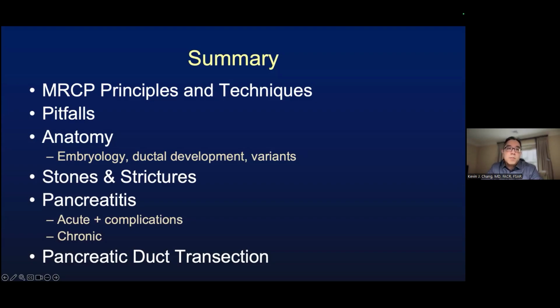So in chronic pancreatitis, you've got inflammation, recurrent inflammation throughout the pancreas or fibrosis or whatever the etiology of that chronic pancreatitis is, and it affects the duct in multiple locations. So you get that beaded appearance rather than the smooth upstream ductal dilatation that you'll see from a single point of obstruction downstream from the duct.